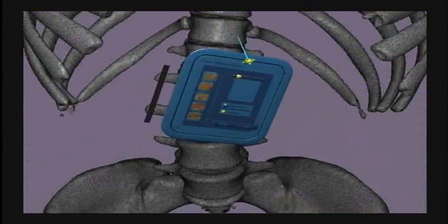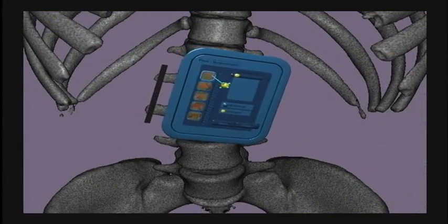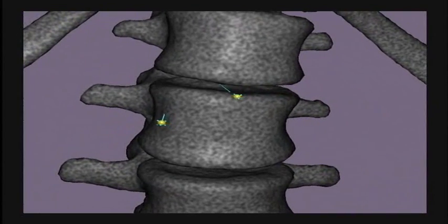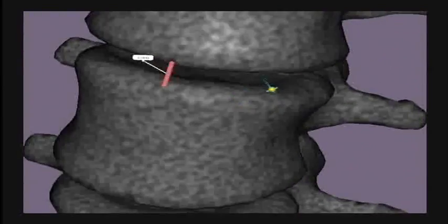In Phase 1, we'll be evaluating iMedic against various tasks, such as measurement and recognition. Here we're measuring the distance between two vertebrae. For a more exact measurement, we use the Two-Handed Interface's fluid scale to place the endpoints more accurately.